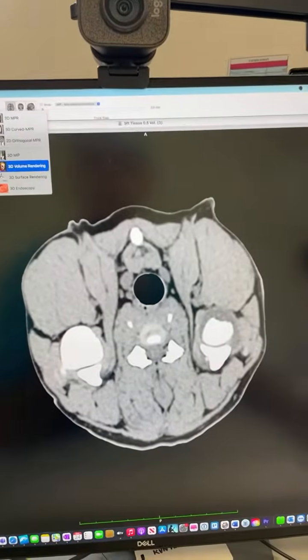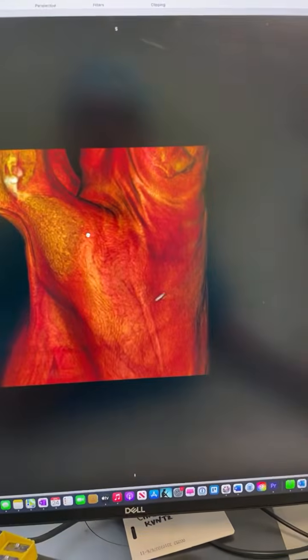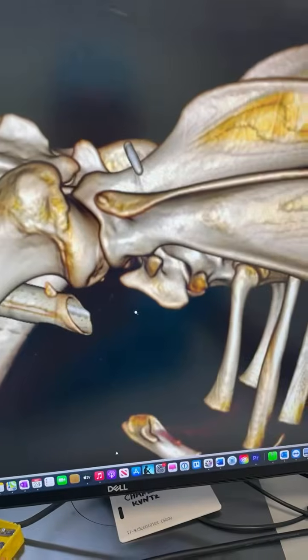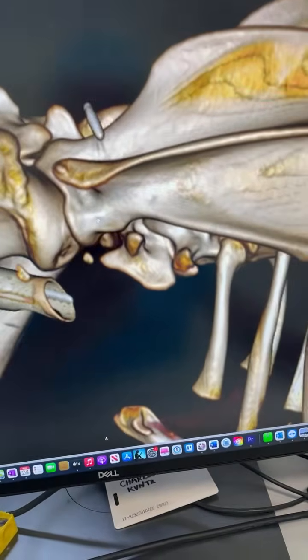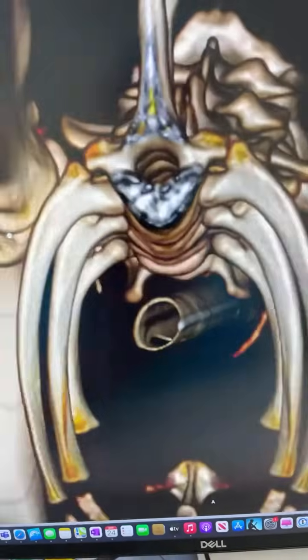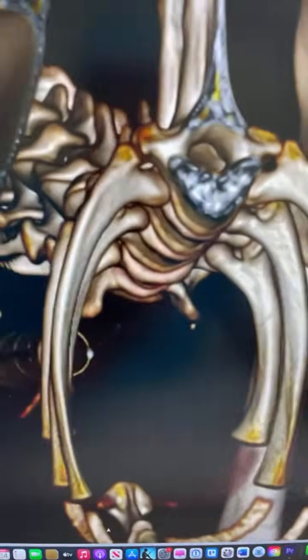So now I'll come back out here, go into our soft tissue scan, and then do a 3D surface rendering or volume rendering. Okay, so that's our left side there, and we'll just get rid of the muscle, enlarge that, and you can see that lesion on the caudal humeral head so clearly there. So that's just a classic OCD lesion. When we look at the other humeral head, we see it's completely smooth. Back over to the affected leg, and big divot back there.